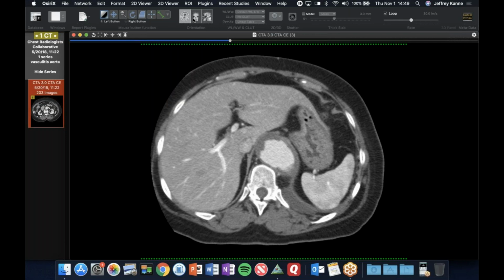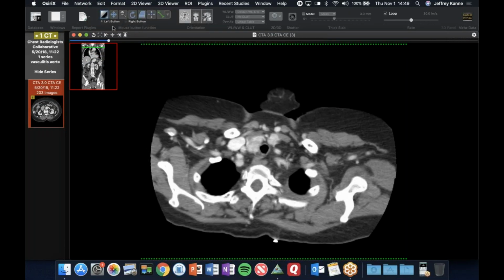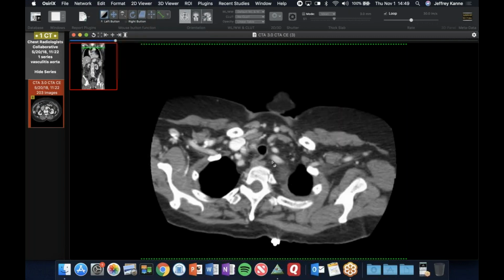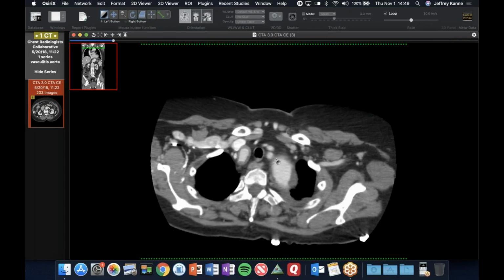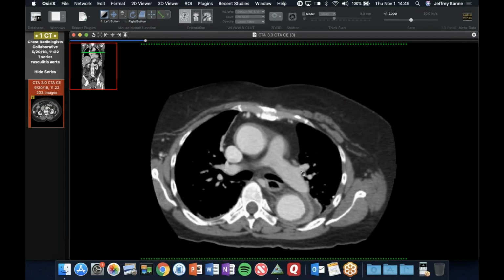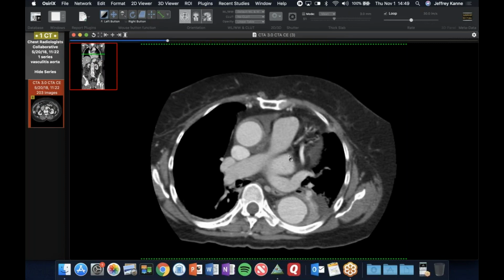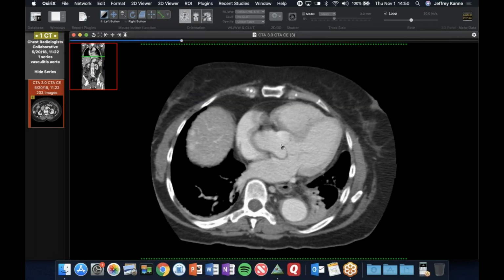Yeah. But there was no coronary involvement. The arch vessels weren't involved. There's a little bit at the origins, but not really. I mean, you look at it, it looks pretty good. I'm sure they did neck exams, and that was all normal. That's interesting. They did a full workup, and this was the only site of disease. And you look at the coronaries, they look really good too. That I have not seen.